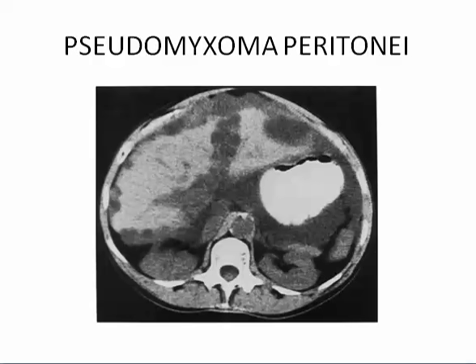This is the appearance of what we know as pseudomyxoma peritonei. Multiple gelatinous-like myxomatous deposits are seen in all peritoneal covering of the liver and in the falciform ligament and around the stomach, and filling almost the whole peritoneal cavity, replacing the fat planes. Pseudomyxoma peritonei.